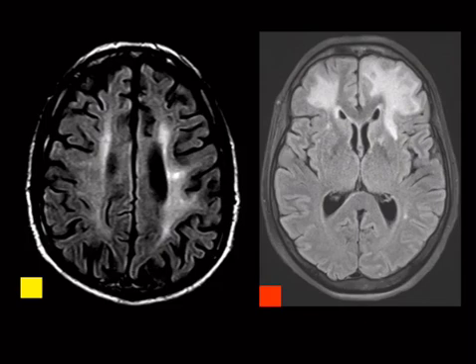So these are two different people, yellow and red. Both of them are immunocompromised, and I'm showing you FLAIR brain MR images. Let's just review real fast how I knew that. So we can see that the CSF is dark, so it's a T1 maybe. It's not a T2. But then if it's T1, white matter should be white, and it's not, so it's FLAIR. So T1 and FLAIR are the ones that you could get mixed up if you're not paying attention, because you just see dark CSF. But remember, white matter should be white, so that's FLAIR.